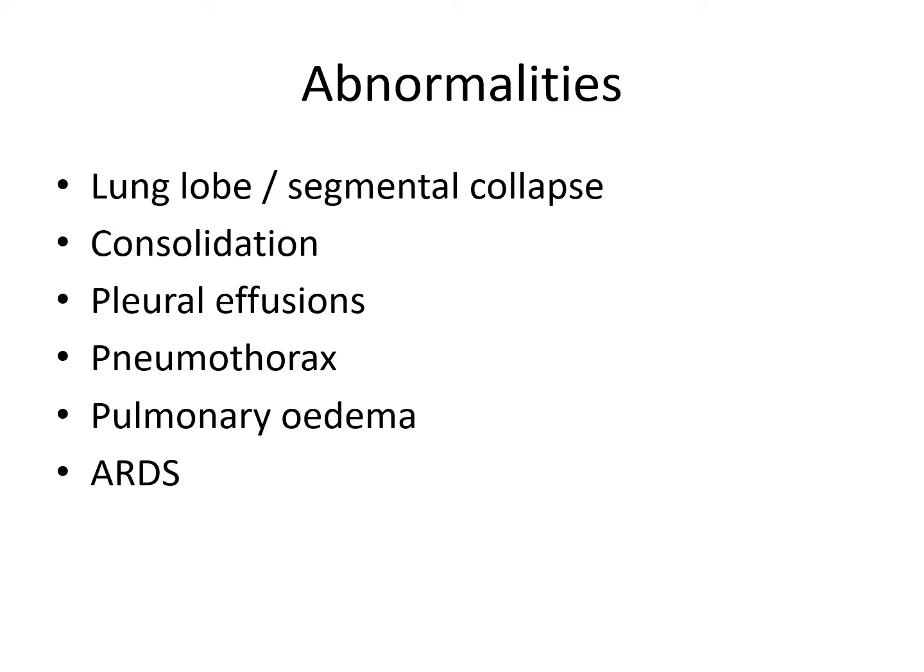So the next one is pulmonary edema. That's an accumulation of excess fluid in the interstitial spaces. Typical diagnostic would be a bat wing shadow. Edema results in blurring of vascular markings, upper lobe diversion and prominent upper lobe vessels.